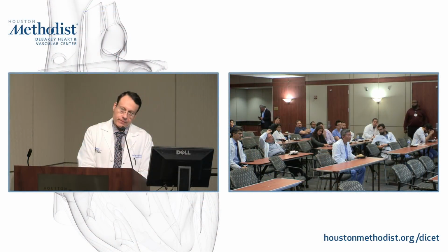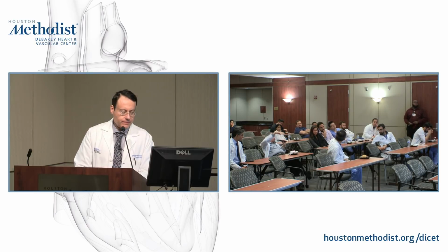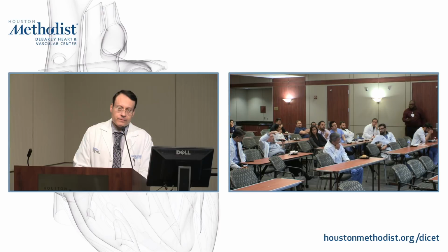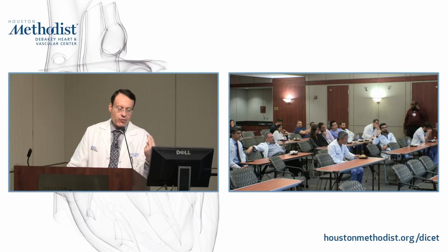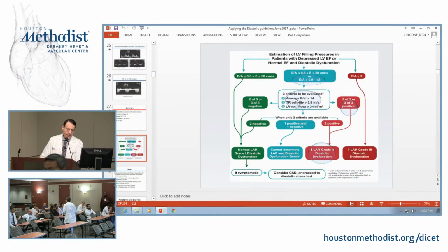One comment, Sherif: in some of these patients where I cannot assess diastolic function because of the signals or whatever, I have taken the position that if there are elements on the 2D to suggest heart disease, and the LA is enlarged and the PA pressure is up, I will go for it. Yes. Even if the signals are yucky. And that is okay, and it goes with the guidelines. Because you will have here two abnormal values, the TR and the LA volume.